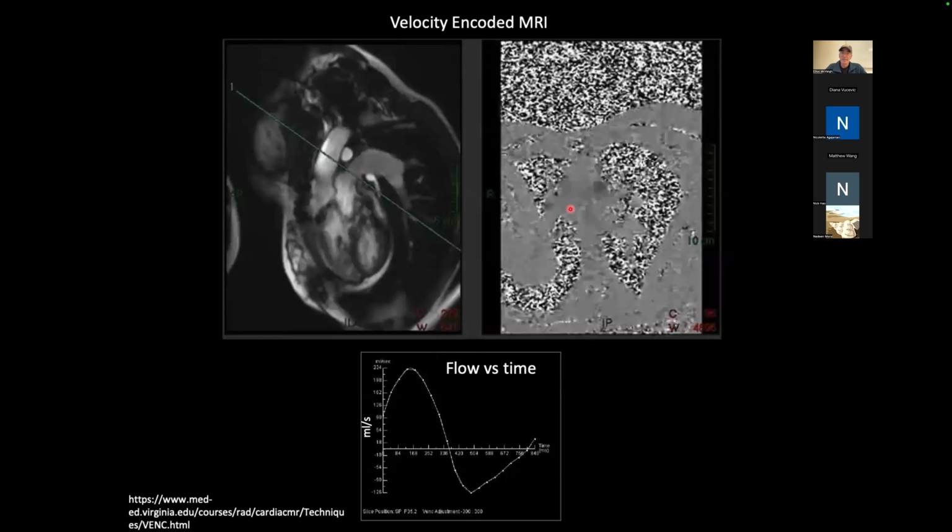So here is an example of that where we have a heart. We'll get it beating in a second. We select a plane through here, which we're going to excite. And this is that plane visualized. And instead of plotting the magnitude of the pixels over here, we'll plot their phase. Okay. And so let's turn this movie on.